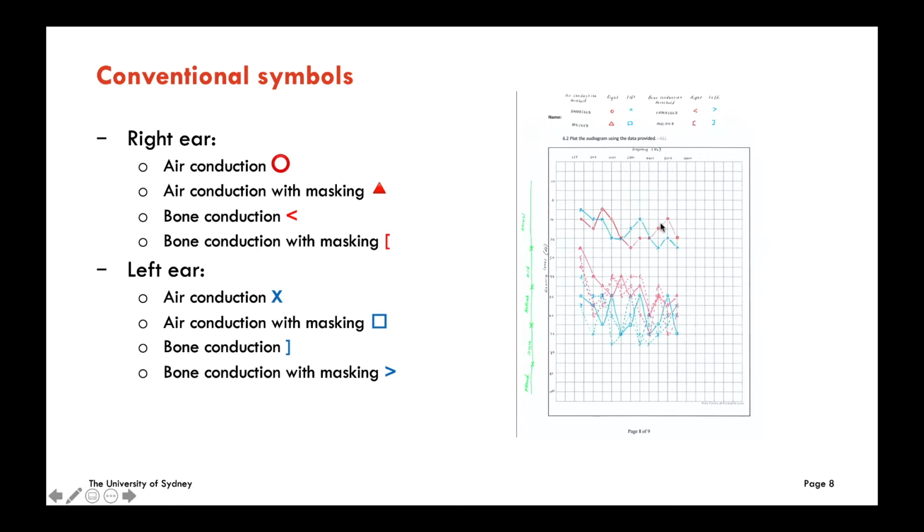But if you remember the case on your assignments, which we discussed during the practical, this person had some kind of hearing loss. That's why you're doing this test. But when you do the air conduction, it appears normal, within the normal hearing thresholds.